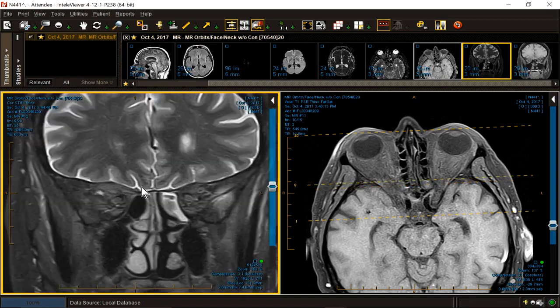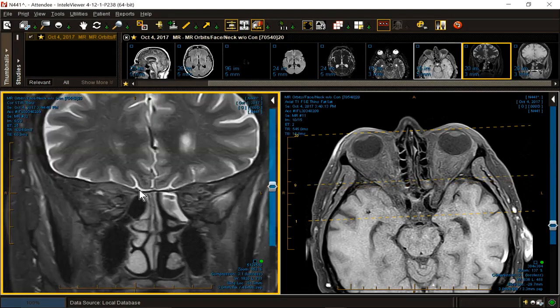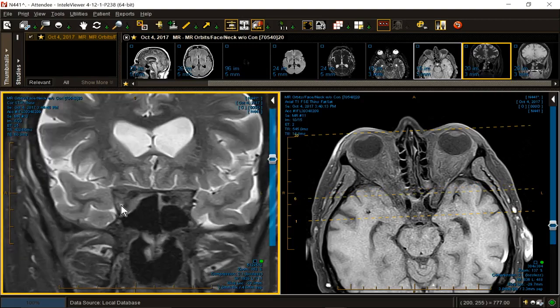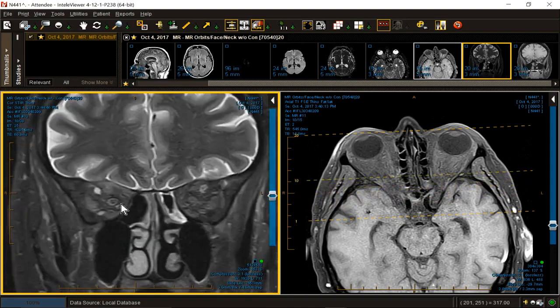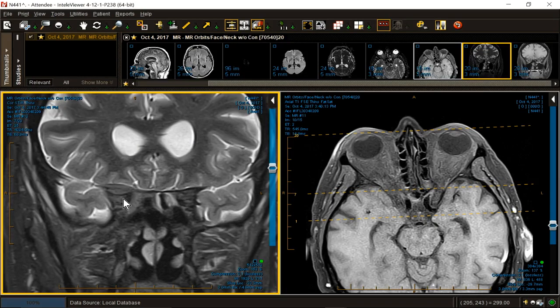Meningiomas are bland. They're fibrous. They're desmoplastic. They're solid. They contain very little fluid, very little cytoplasm. And this one is in very close proximity to the optic nerve and orbital apex. There's your optic nerve. Let's follow it back. Oh, it is getting encroached upon by this lesion right here. That's your optic nerve. So this is a tough one. Now, had you been given contrast, it would have been easier. But they weren't suspecting the diagnosis from the beginning. The history was blindness in one eye, and for whatever reason, they were considering MS.